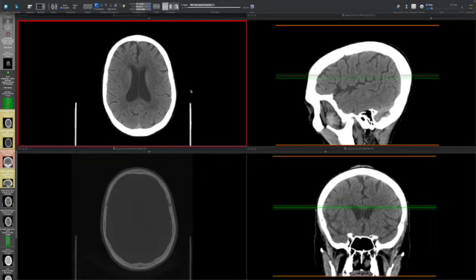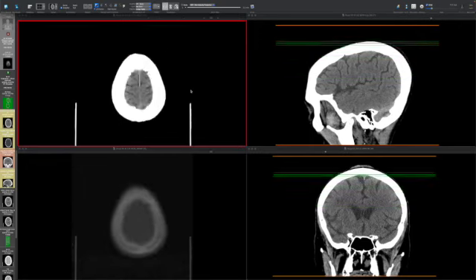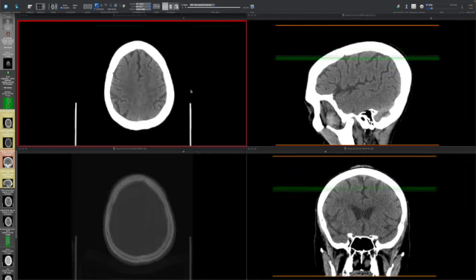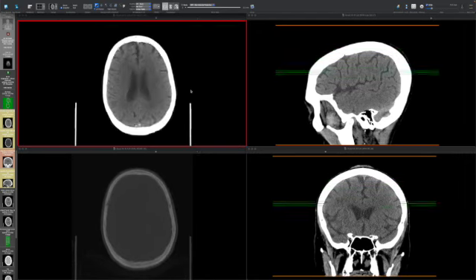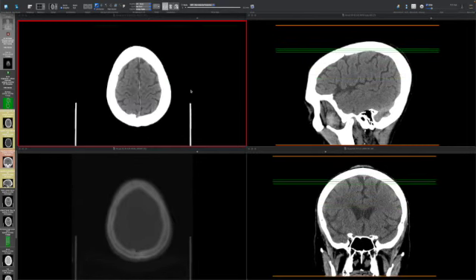While I can't tell you everything that would be going through my mind normally as I'm looking at a head CT, I can give you the basic signposts of where to look and a general pattern with which to start. So that's what we're going to do.